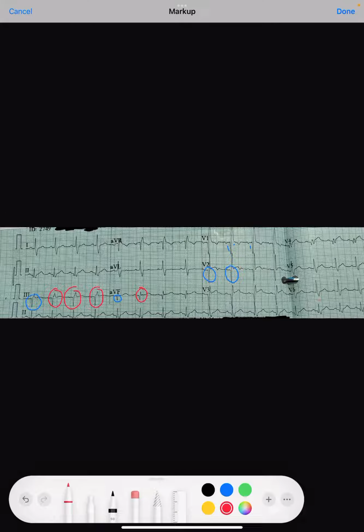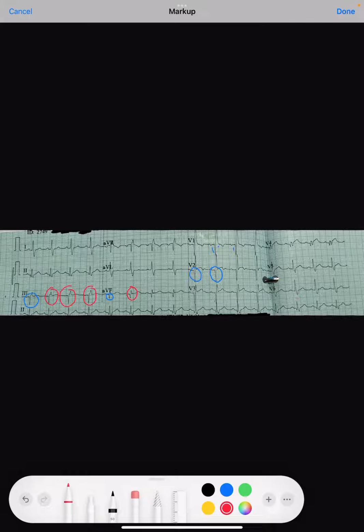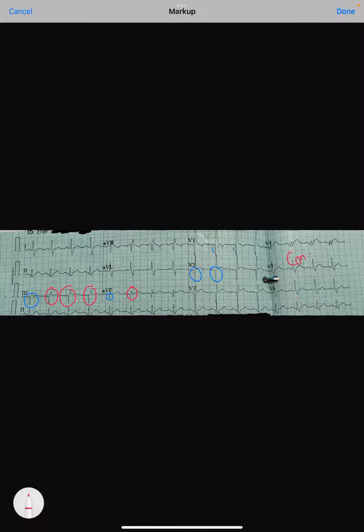So always try to look for the Q waves, because Q wave will tell you that the patient had an earlier MI. Q wave should be present in the consecutive leads. If it is present in consecutive leads, then it suggests that it is significant, and usually it should not be present at all. It is very commonly present in lead 3, but when it is seen in all the consecutive leads, that is lead 2, 3 and AVF, we call it a significant Q wave.